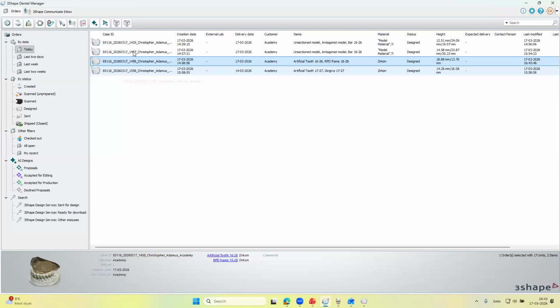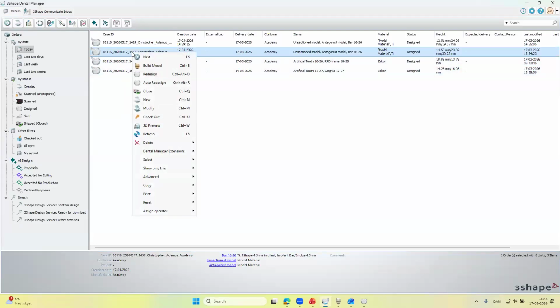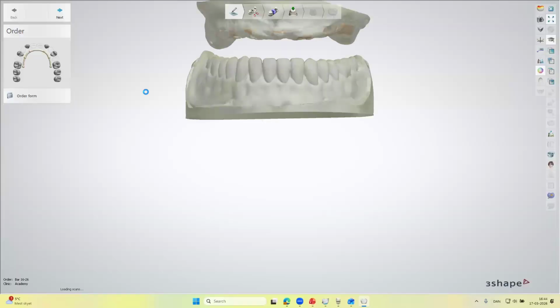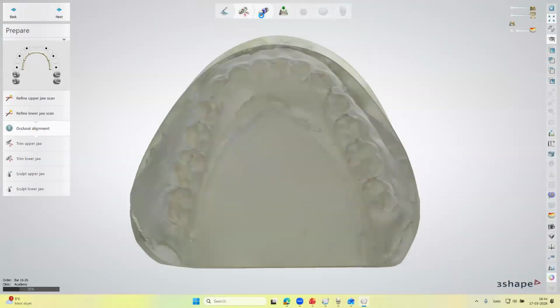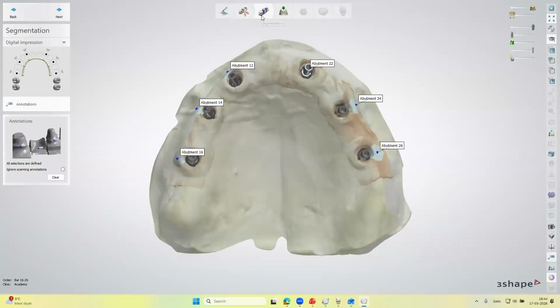Okay, there's also the other bar that I have made. This one is a little bit simpler in the design. So for this, I just used a simple tapered shape for it. I'll just quickly go through it to show you the differences and to show you cutting, which I didn't show you on the earlier one.